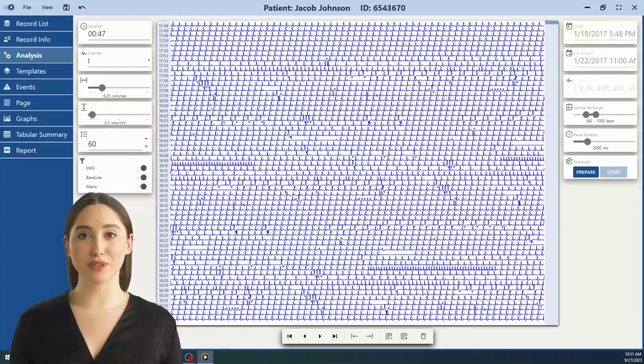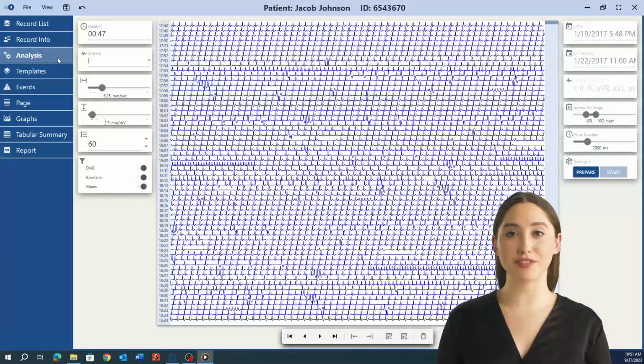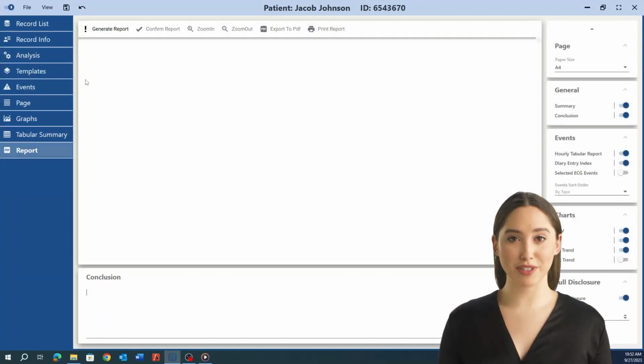In this video, we will go through the workflow of analyzing a patient's Holter test record and reviewing analysis outcomes. In our previous videos, we have presented the general overview of the NORAV NH301 Holter analysis system to show the basics and its functionality, as well as the pre-analysis workflow: what you need to do before initiating a Holter test and what steps to take after its completion. Now, we will cover the procedure for conducting the analysis, reviewing beat templates and events, and how to set up and generate the final report.